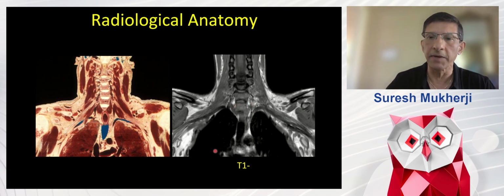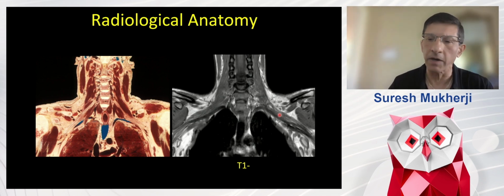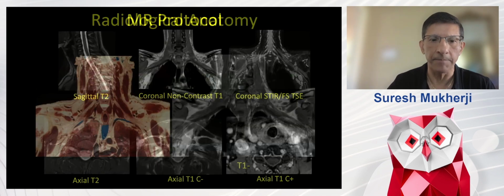So this is another example of the brachial plexus. Lots of beautiful anatomy. We see the lung apices as we just saw before. We can see the vertebral bodies. Now, the way that I look at this is I find the subclavian artery, and lo and behold, there are the cords of the brachial plexus running right along it. On the left-hand side, there's the subclavian, the axillary artery. There are the cords of the brachial plexus. So what I want to emphasize to you is look for these big structures that we all know are there. And once you find those big structures, just like that man serenading the woman or the woman under the arch, the brachial plexus is right there for you to see because it's been staring at you full time.